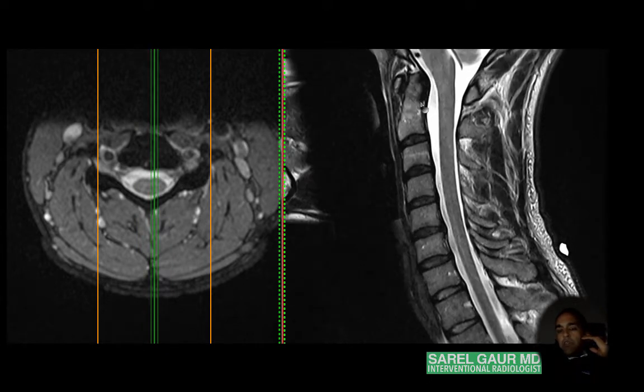I typically start with the column, and I initially address the alignment. You might think, what's the significance of that? Well, the significance is that if the alignment is off, you could be picking up some abnormalities. If there's not a nice gentle curvature or lordosis, you could be picking up on a potential traumatic injury where one level is traumatically injured and there's a focal change in the curvature, or maybe the whole thing is straightened and stiff in a degenerative neck.